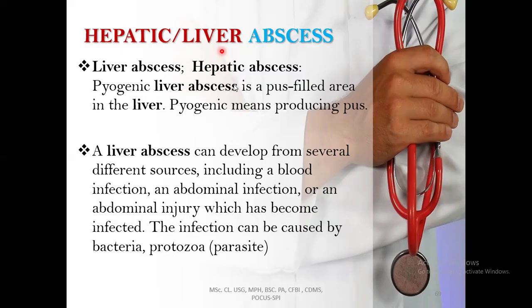I was asking about the liver images that you were presenting, whether it was decompensating type or something like that. Okay. So the thing is that when we say decompensated on ultrasound, what you are going to see first is ascites. Once you see ascites, you should know that it is at least stage 3.